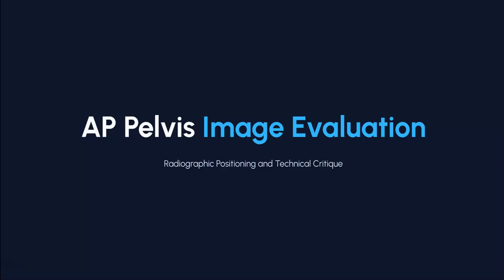Hello everyone, my name is IStine, and today I will be presenting my image evaluation for an AP pelvis radiograph. Throughout this comprehensive presentation, I'll be breaking down the positioning accuracy, the required anatomical structures, and conducting a highly critical analysis of the technical quality and degradation present in the specific exposure.